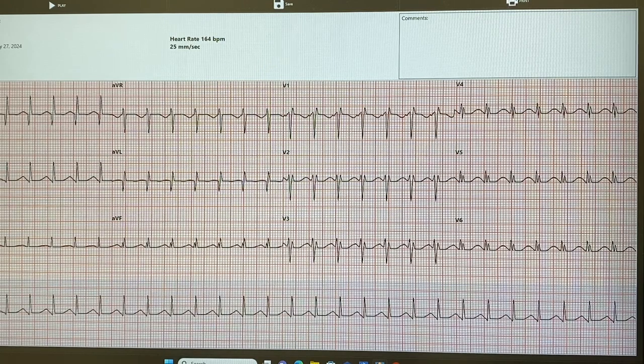A tachycardia. So we have a last name, it's a tachy. Now, what kind of tachy? Now we need to look and see if the P wave is normal, or if there is a P wave. Is there a P wave? I would say yes. So what's the first one to disappear? The P wave. Why? Because they hide when the QRSs are more frequent.